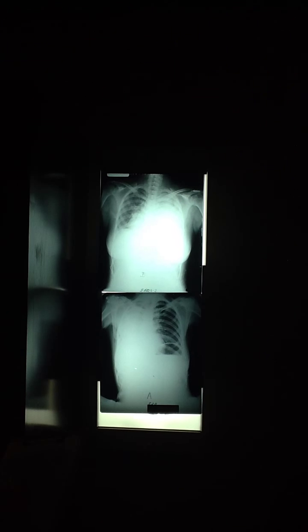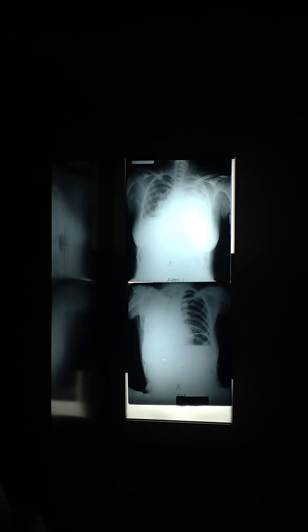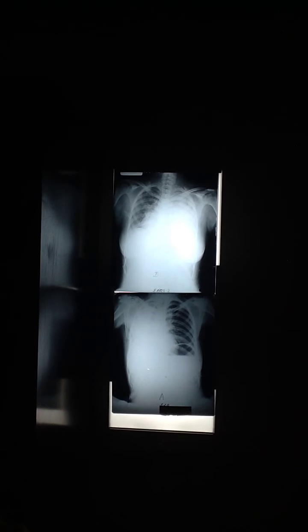Is it consolidation? Is it atelectasis? Is it tumor? Is it pleural? Is it external chest wall? Now, what can we eliminate easily? External chest wall. Why? Well, look at all the silhouettes. It can't be on the external chest wall and silhouette anything except the external chest wall. So E's gone, easy. Now, if it was consolidation, it would have to be every segment and every lobe on that side, wouldn't it? Which is possible, but unlikely.